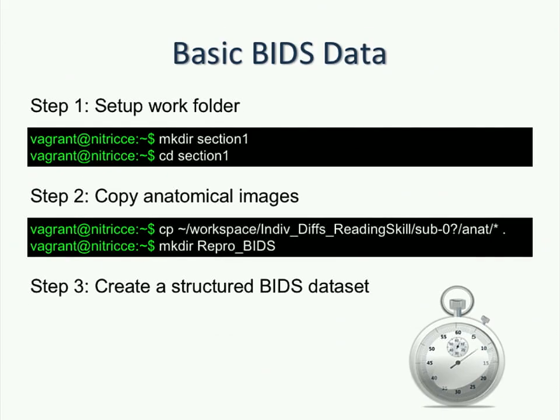Then we're going to create a folder called reprobids, which is going to be your BIDS directory where you're going to structure the data and create your folder hierarchy.